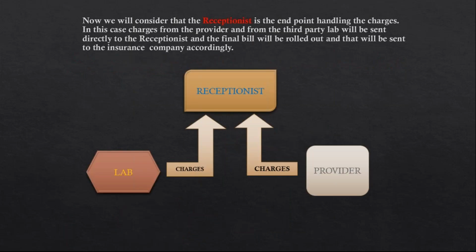So once this encounter is closed, once the appointment is done from the doctor's perspective, that is when the charges are generated from the EHR application as well as from the lab application, and this charge information will be sent back to the receptionist so that the receptionist can get the amount either from the patient or generate claims and submit the claims to the insurance companies in order to get the amount back from the insurance companies. Okay, so there are two different methods altogether.